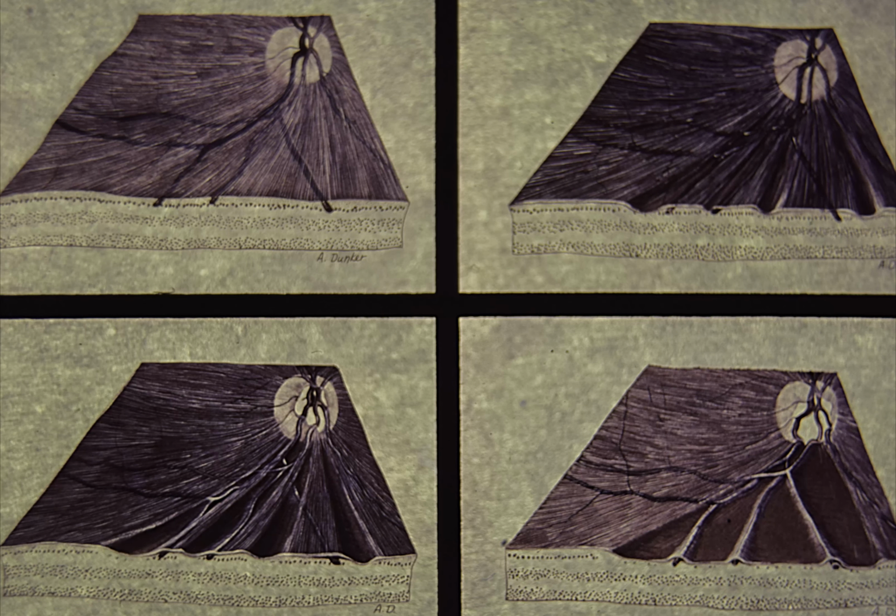Slide 61. Optic atrophy. Although there are many causes of optic atrophy, the clinician's main concern is whether or not a compressive lesion is responsible. For this reason, early diagnosis is imperative if vision is to be saved. In an effort to diagnose early optic atrophy, we emphasize changes in the peripapillary retinal nerve fiber layer. Interruption of axonal function in the anterior visual pathway causes visible morphologic changes.